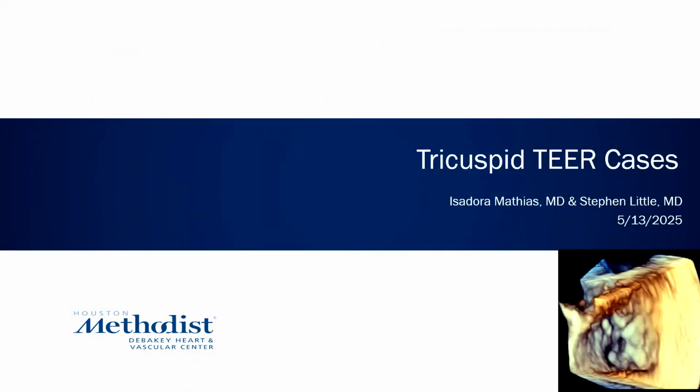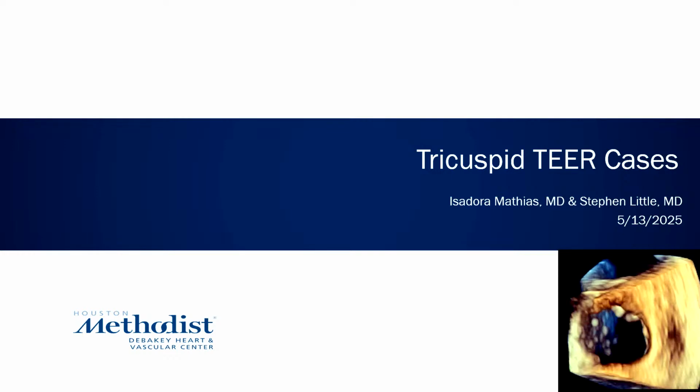And this video is what you're not going to see today, which is a normal tricuspid valve.